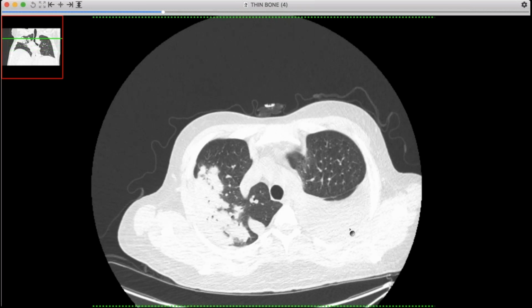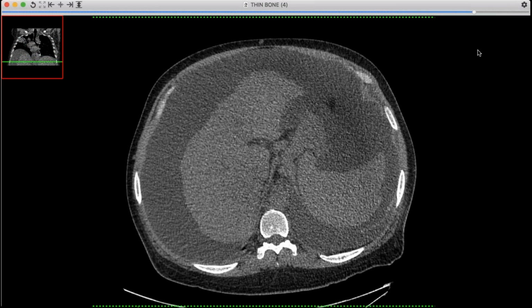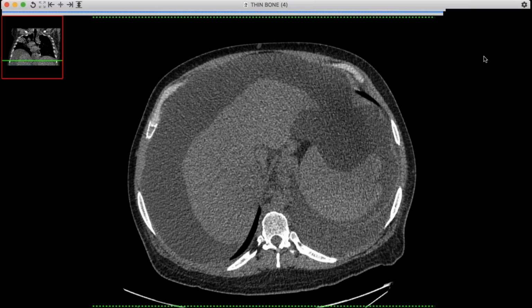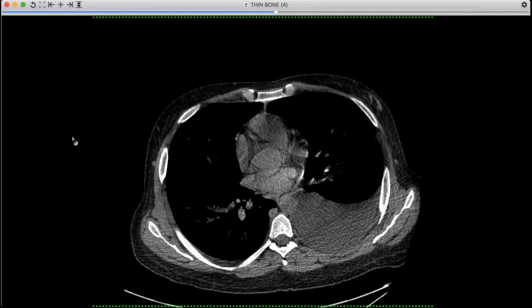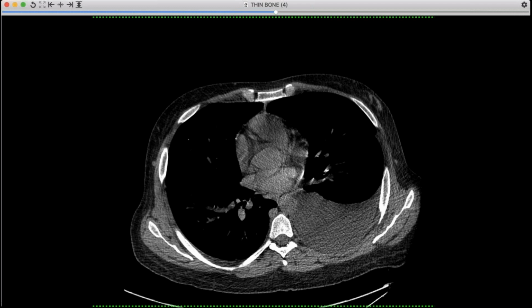And then, which is just kind of an interesting finding, is the dilated azygous vein in the azygous fissure from his portal venous hypertension. And there's his ascites and cirrhotic liver and such. So he wasn't responding to typical organism coverage. And so eventually they were able to recover a fungus, and this ended up being Cryptococcus neoformans.